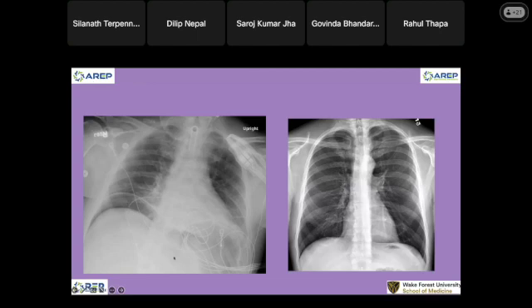I'm going to show you a few more cases. We call this intraperitoneal air. This one I showed you yesterday, but I did not show you the CT. So we see a big mass. This person has a big pneumoperitoneum. If you are reading the study on the left here, there is a big, huge mass in the right.